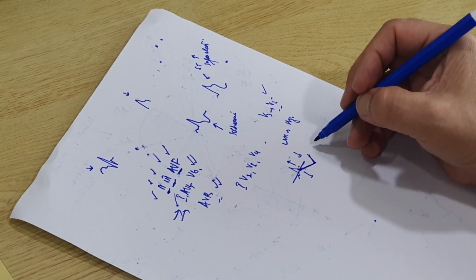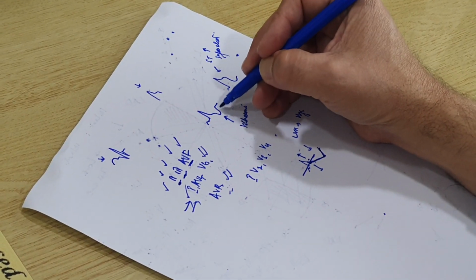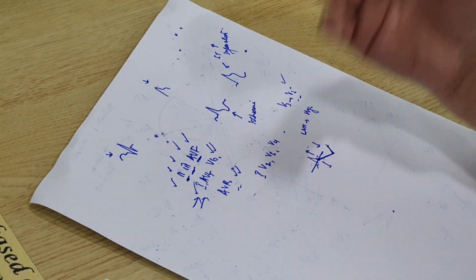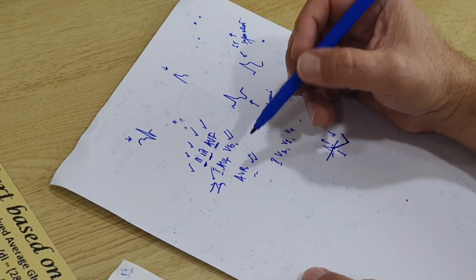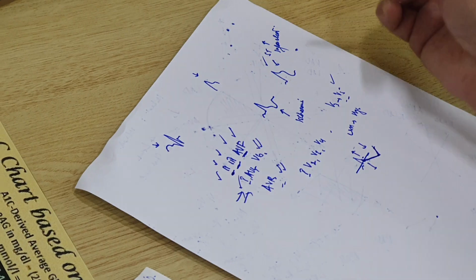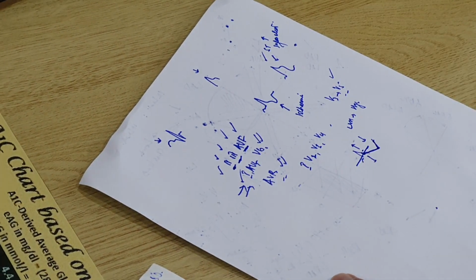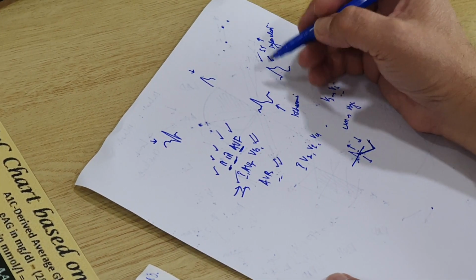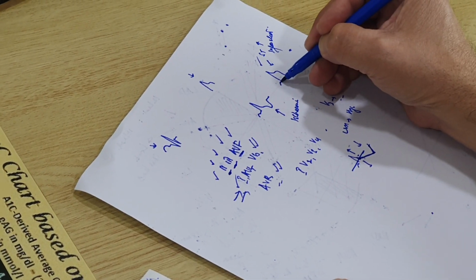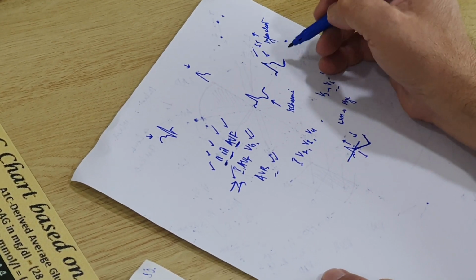So as I said, there are different anomalies. For instance, if you've got global ischemia, you will see that there is T wave inversion in multiple leads, several leads, implying that there is global ischemia. If you've got infarction in more than one area, you will get ST segment elevation in more than one area. But likewise, you will get reciprocal changes in the other leads, which are the contralateral leads. So this is how you can find out quickly, looking at an ECG, whether somebody's got ischemia or infarction.